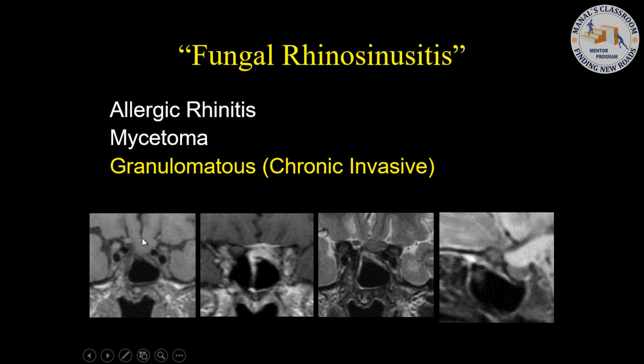And this is a coronal T1 weighted image, and this is the optic nerve, and we see this mass that's located here, just below the optic nerve. And when we give contrast, we can see this densely enhancing, and there's a little bit of enhancement here along the meninges. Everybody see that?